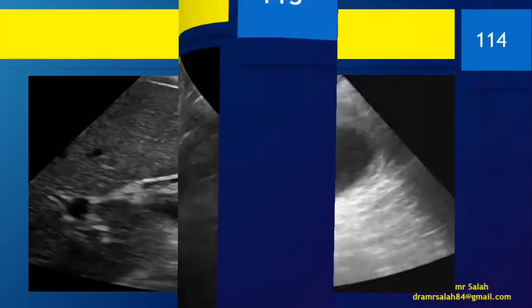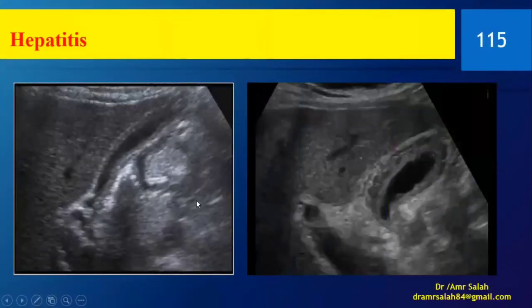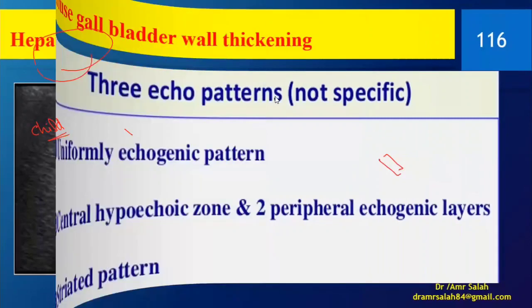Here there's the gallbladder wall thickening and the stones. My report will depend on the whole picture together. Okay, what about this? I have here impressive gallbladder wall thickening. Look at this, this is very impressive. This is what's called striated gallbladder wall thickening. However, there is no stone, and this is a child with a history of vomiting and jaundice. Right away I would know that this is a clinical picture suggestive of hepatitis. So it is the combination of the signs along with the clinical picture that would make my diagnosis.